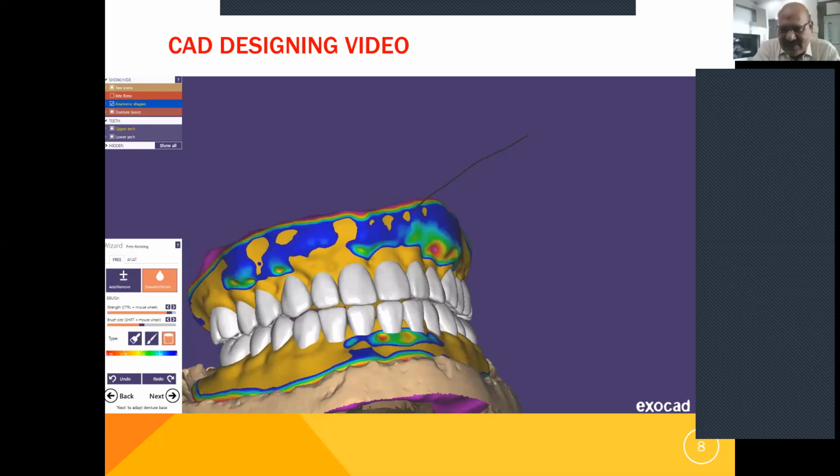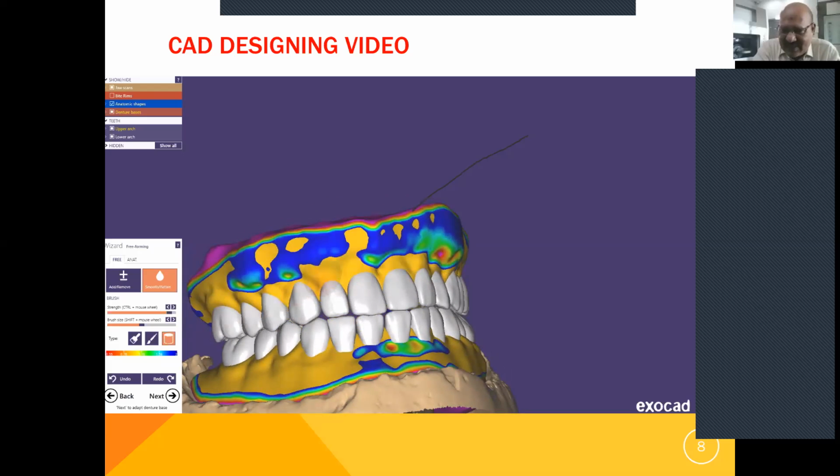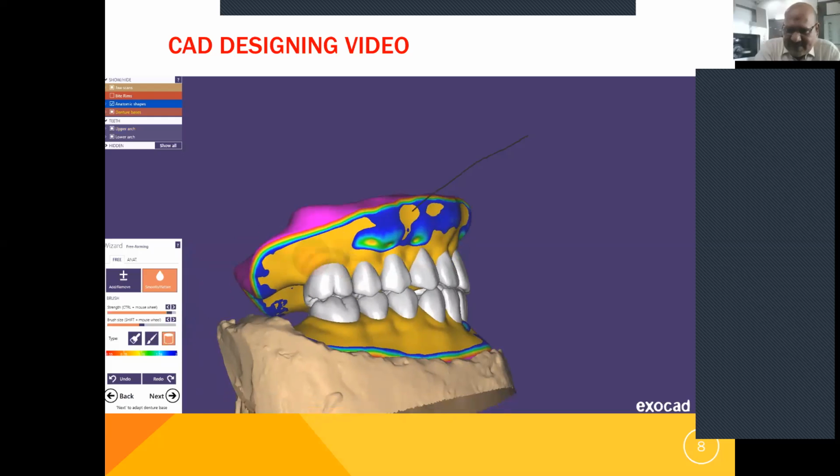And ma'am, this is all real time working on the CAD. Yeah, thank you. Thank you, doctor.